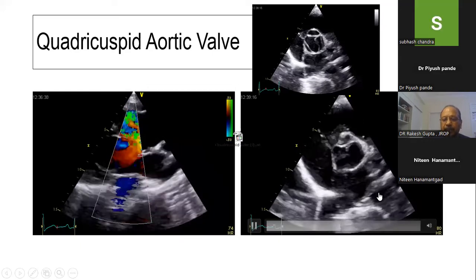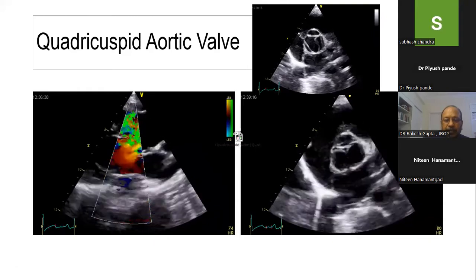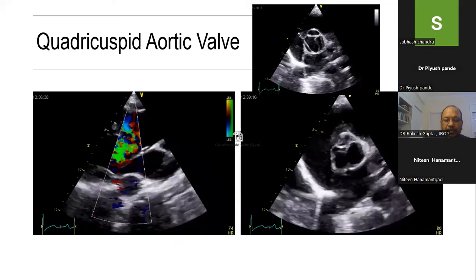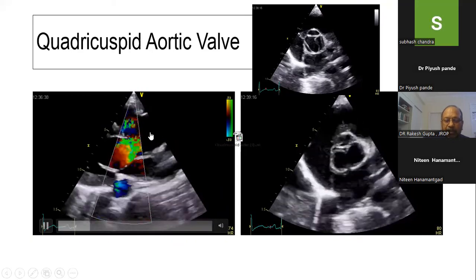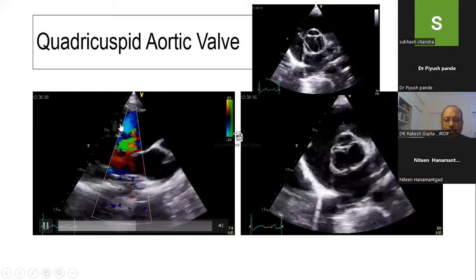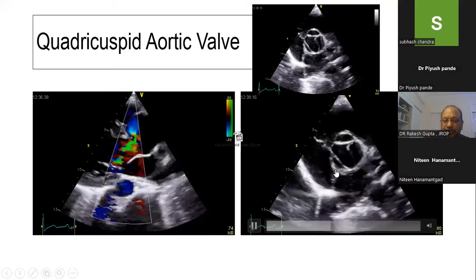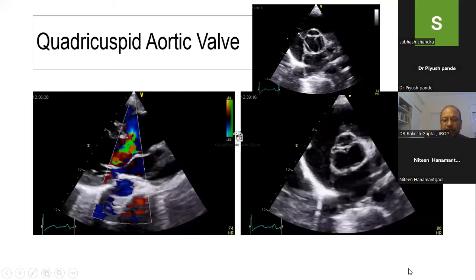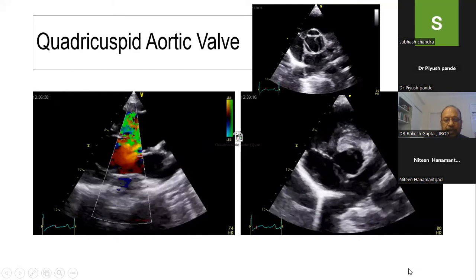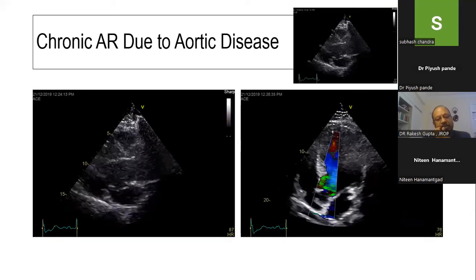But sir, why could it not be a flap of a dissection, sir? As you said, more than one set of valves. I said a flap of dissection will be 2 valves. One valve over here, one valve over here. I'm talking of the annulus. This is in the annulus. This is quadricuspid. And you know what is the routine, aortic valve leaflets, 3 of them.